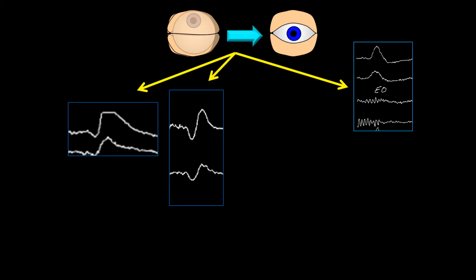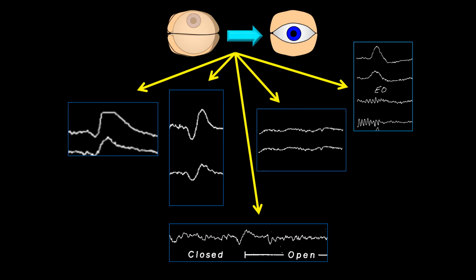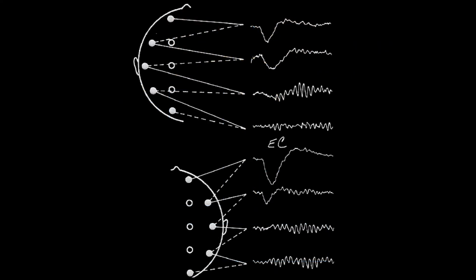Sometimes it gets a little bit more biphasic, even starting to look triphasic. At times, it is hardly perceivable. And at times, it is not perceivable at all.